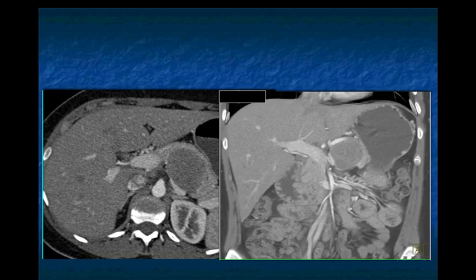You go through things. It doesn't look like adenocarcinoma. It could be a neuroendocrine tumor, though usually those are vascular. It doesn't look like serous cystadenoma, even the solid variant, which tends to be more vascular.